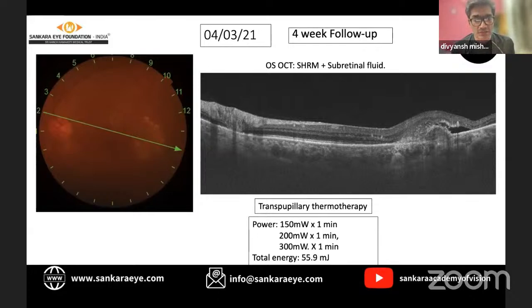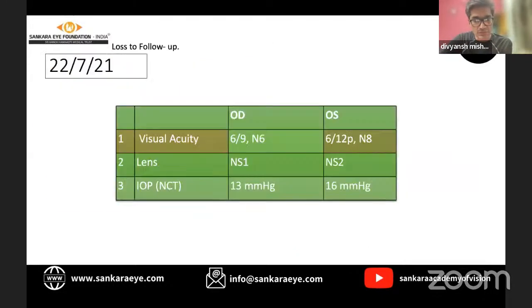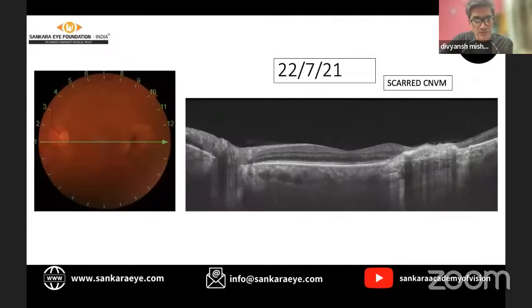That's from Nikita. She's asking where exactly do you put the spots? It's as good as doing a PDT and having a GLD of 0.5. In this case, if we put both photographs together, the pre and post, I think we would understand the whole yellowish area is what my target lesion was and where I have treated.